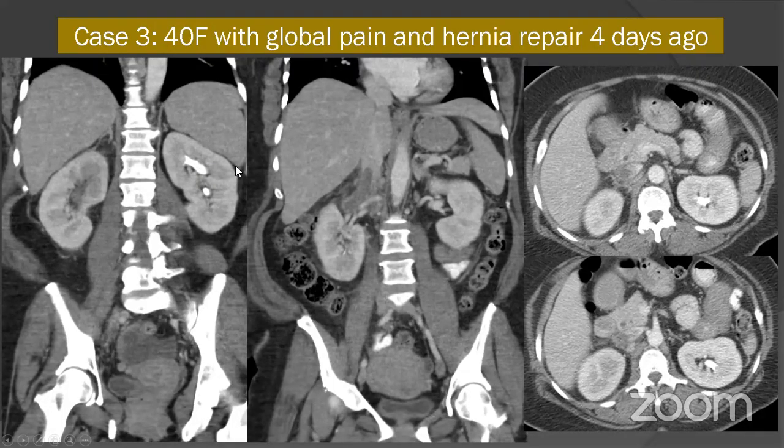Now, it's on the same theme. We are talking about asymmetry in the nephrogram. So somebody has mentioned a left staghorn calculus. Be very careful when you're looking at contrast-enhanced examinations. This is a contrast-enhanced study.